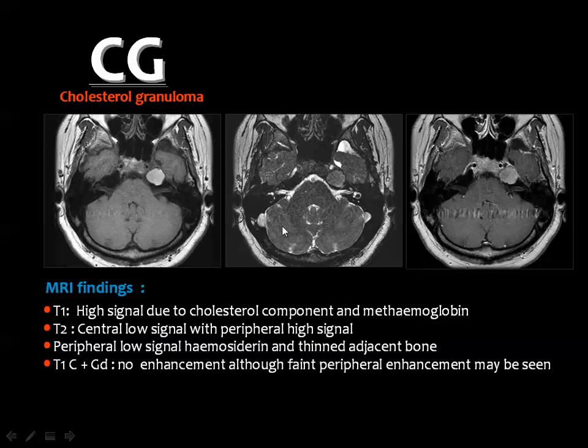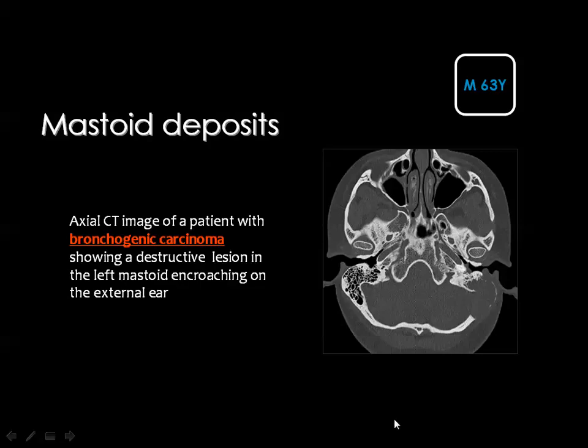And this is another example, a cystic lesion of bright signal in the T1 weighted image and less bright signal in the T2 weighted image because of the suppression of fat. Then if you inject contrast material, it will not enhance. And sometimes you can have a peripheral low signal rim of hemosiderin, and also you may see faint peripheral enhancement after contrast injection.